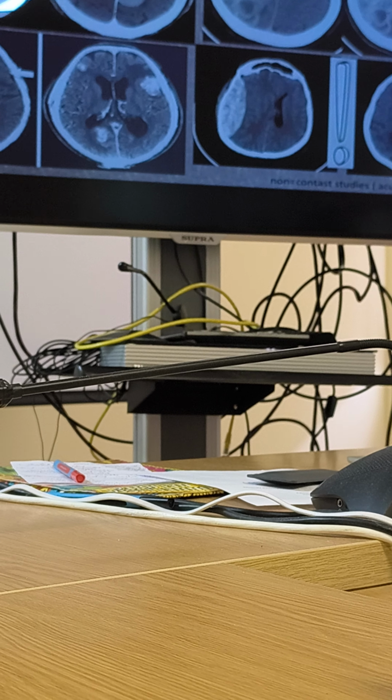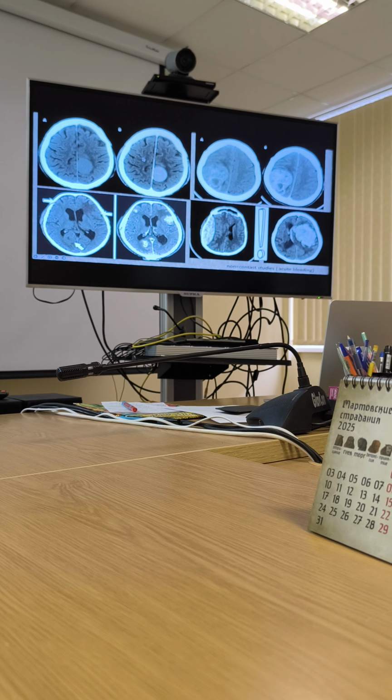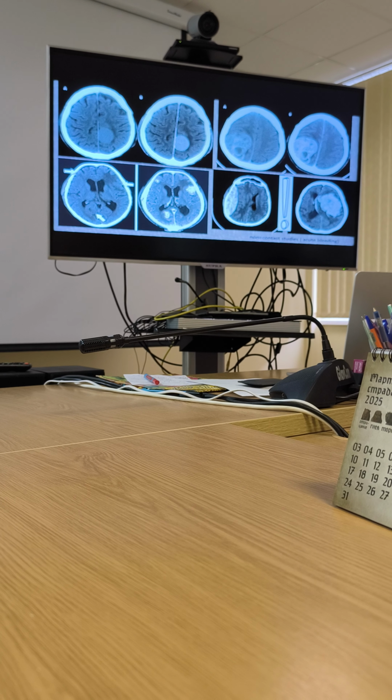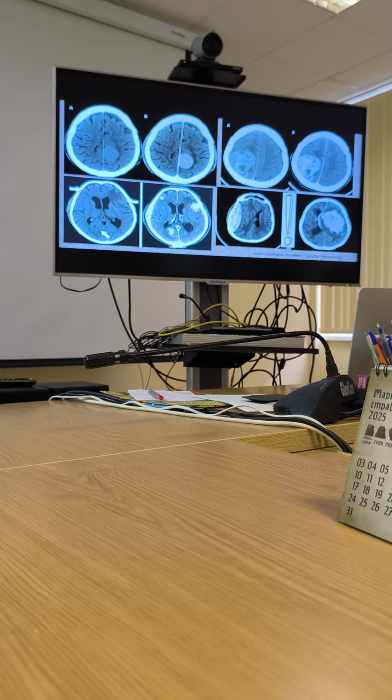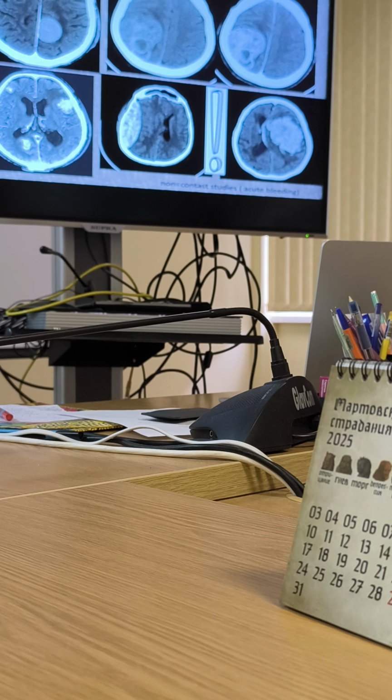Yeah, I'll show you right now. Okay, yeah? So let's figure out, yeah? So what is the effect, yeah? This lesion is getting a little bit whiter, yeah? And this lesion is homogeneously whiter. And compared with that lesion, yeah, it's getting more white in comparison.